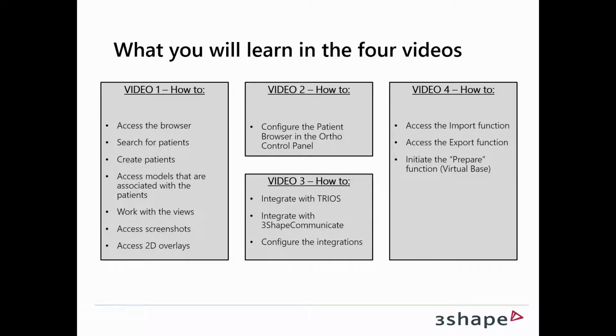And finally, the fourth video will show you how you access the import and export features, and also how you get access to the prepare function, allowing you to do a virtual base. So in total, 14 short how-to tips. But let's get started.